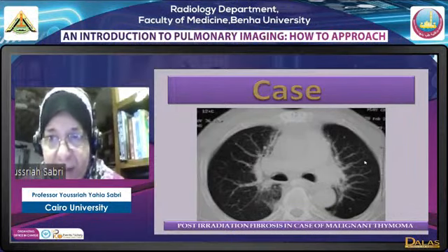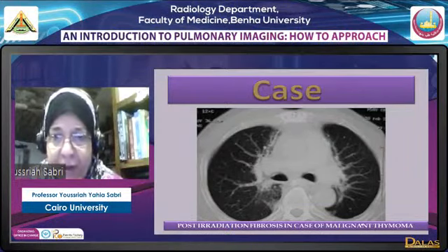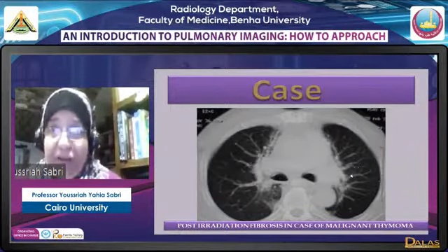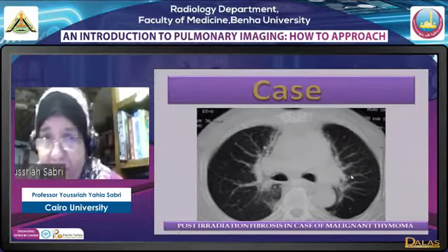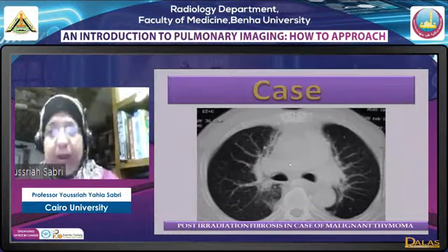Now, if you see it bilateral, as in this case, it suggests either a bilateral lesion or a central mediastinal lesion. Higher up than this, we will consider a thyroid. Here, actually, it was post-irradiation fibrosis due to malignant thymoma. If you find this lesion unilateral, it may suggest breast cancer, maybe, or irradiation for a bronchogenic carcinoma. Bilaterality suggests I'm dealing with a mediastinal lesion.